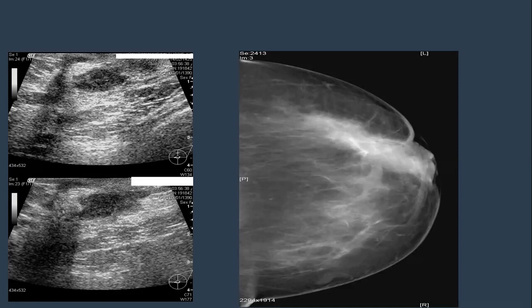Idiopathic granulomatous mastitis. One of the differentials, idiopathic. And if it is not idiopathic, yeah, you are right. But usually idiopathic doesn't give discharge, giving some ulcerations. Yeah, it can, but rarely complicating, giving all these things. But as you agree with me, it is not common. Okay, yes, but it can be specific granulomatous mastitis.